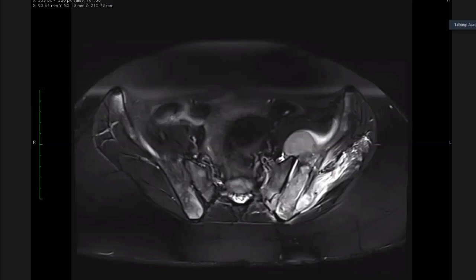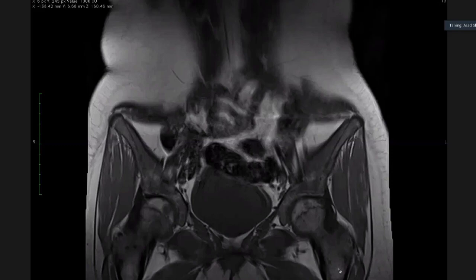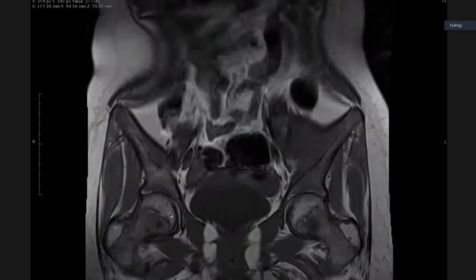What was the first diagnosis that you told me it could be? The Ewing's. Yeah. Okay. Have you seen Ewing's in this place? Sir. Okay. What does Ewing's look like? I mean, what's the typical appearance of Ewing's? You've got a medullary, a bone-based marrow abnormality, but there is this extension of the tumor outside. Large extraosseous soft tissue. T1 changes in the whole of the skeleton, almost all of the visualized bones.